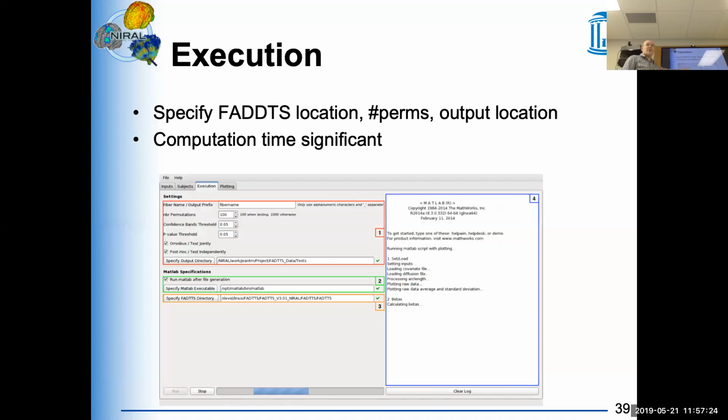Now you put it to 1,000. 1,000 is kind of a minimum. Anything above that usually is not necessary. You can go all the way to 10,000 if you're worried that you're not appropriately sampling. It also depends a little bit on the number of subjects you have: the higher the number of subjects, the higher the number of permutations you should use. But if you go to 10,000, I cannot see any setting where that's not a little bit of overkill. If you go to 10,000, you'll always be fine, but you also wait much longer.